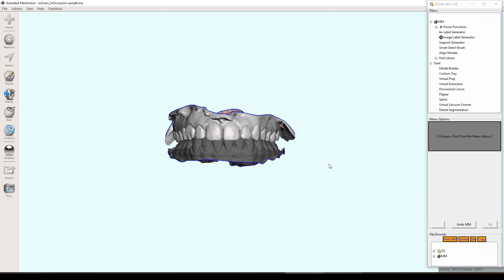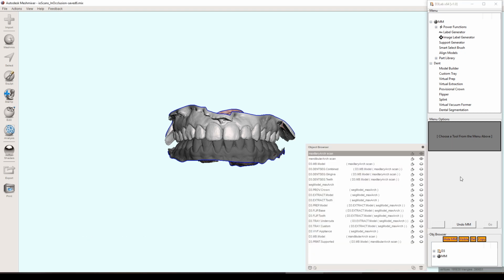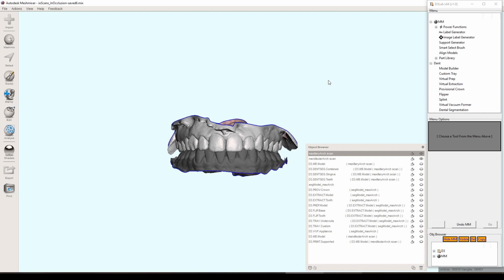Basically, from your input scan, you can now generate, let's see if I can show you here, all of these different things. All the different tools here are all working, as far as I know. I've tested them to the best of my ability on as many different models as I can. And like I said, I basically use this on a daily basis anyway. So it's something that I use regularly, and I hope that everyone else will use it in the same way, and it's as easy to use as I think it is.